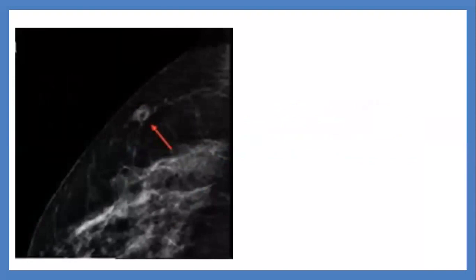Okay, what about this one? Yes, we touched on the normal and abnormal, but we would like to emphasize this. It is well circumscribed, with a fatty hilum, and the location of the lymph node is near vessels. So, is it typical or atypical? Normal or abnormal?